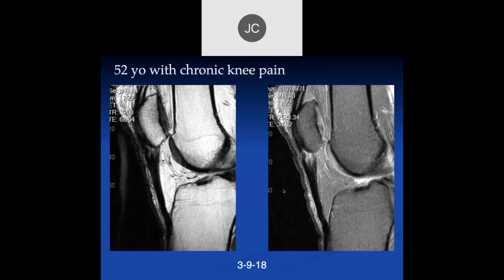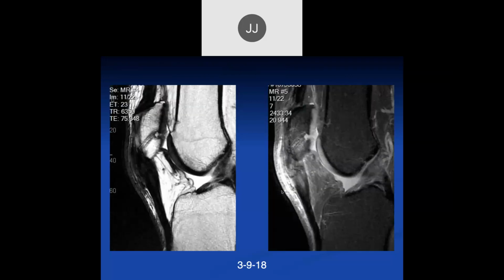And then here, did they do anything? Yes, here you can see, they did surgery to reimplant it. I don't know, I guess, why did they do that? I mean, the procedure that I'm looking at is not the way I would do it. What you do is remove the distal pole portion of it and then reattach it with drill holes and sutures. What is that going through the patella?